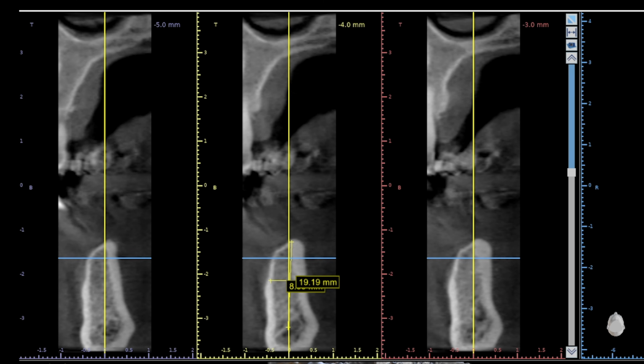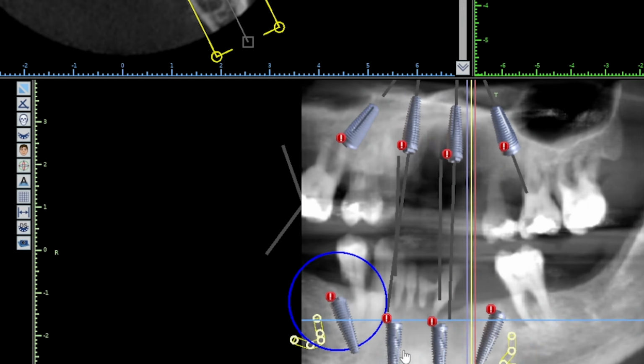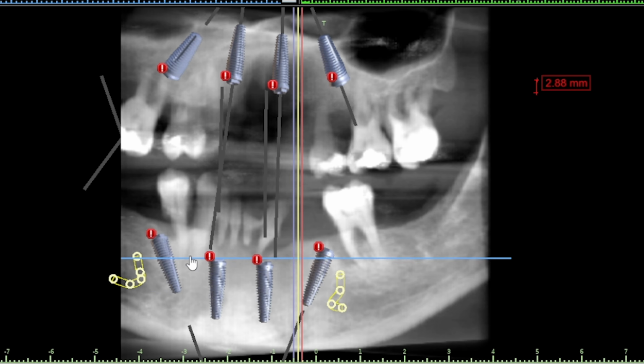So on this software, we can actually now position our implants, okay? And all these implants have different characteristics. The angled ones have something called a coaxis. The straight ones, all different sizes that we've got, different widths, different lengths, and we choose the most appropriate implant for each and every site, okay? So we've gone for a standard 4 at the top, 4 at the bottom here.